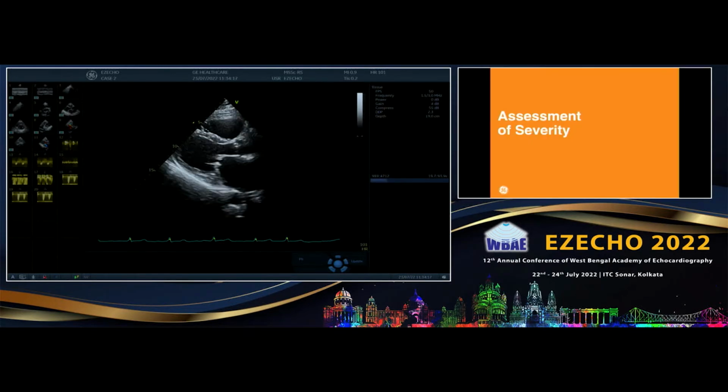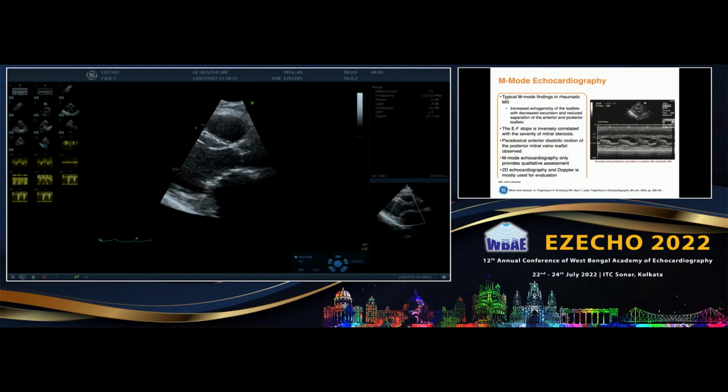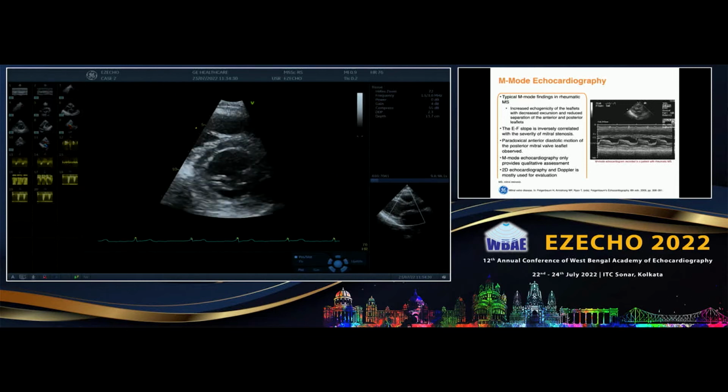Now let us look at the mitral valve orifice. If you have a biplane view, then it's very good, because then you can put another plane perfectly at the tip of these leaflets so that you get a short axis on this side. In a short axis, mitral stenosis should always be measured first with planimetry. Do not use anything else.